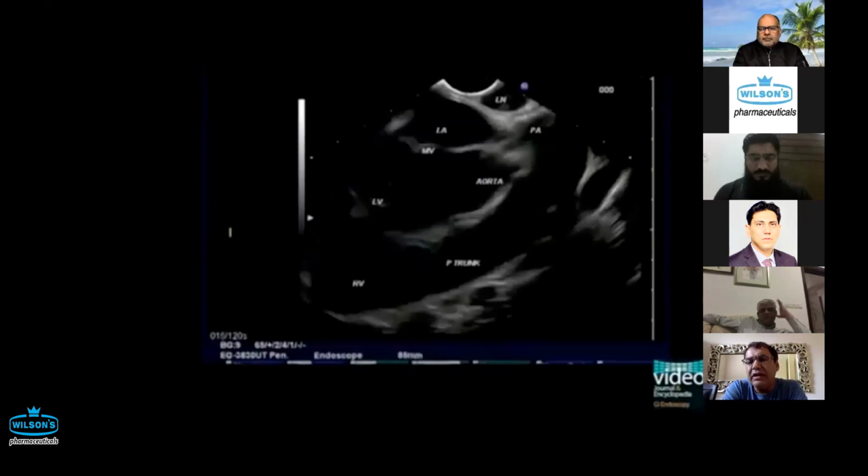If they are very enlarged, conglomerated lymph nodes, their structure and their echogenicity guide you as to whether it is a pathological or a physiological lymph node.